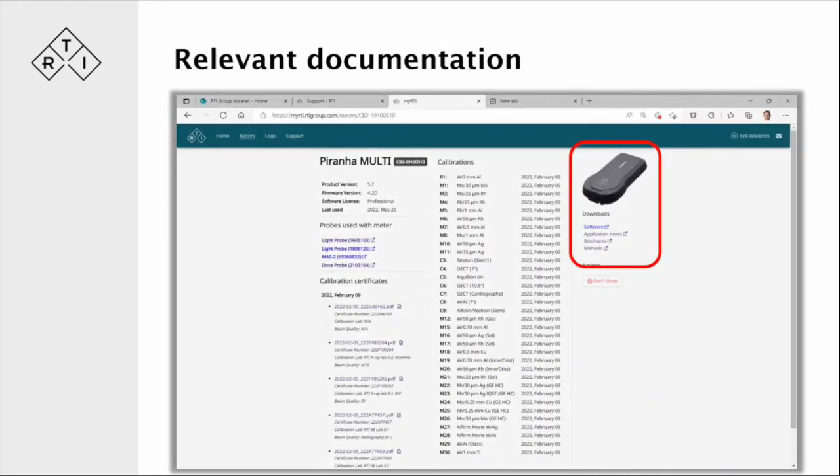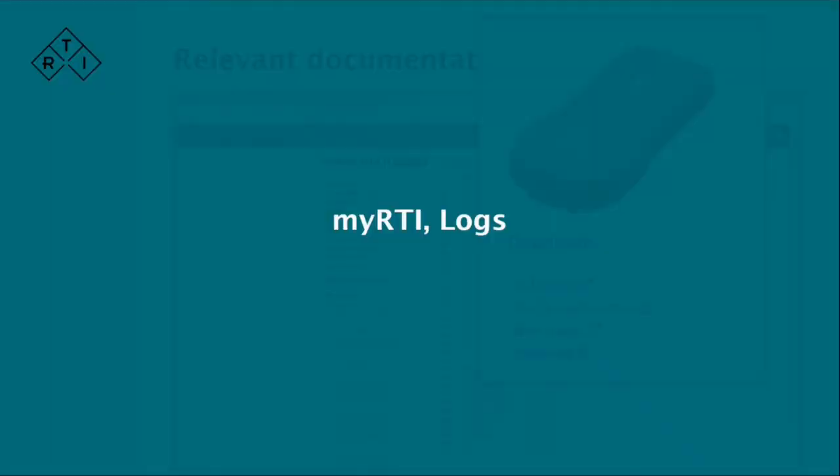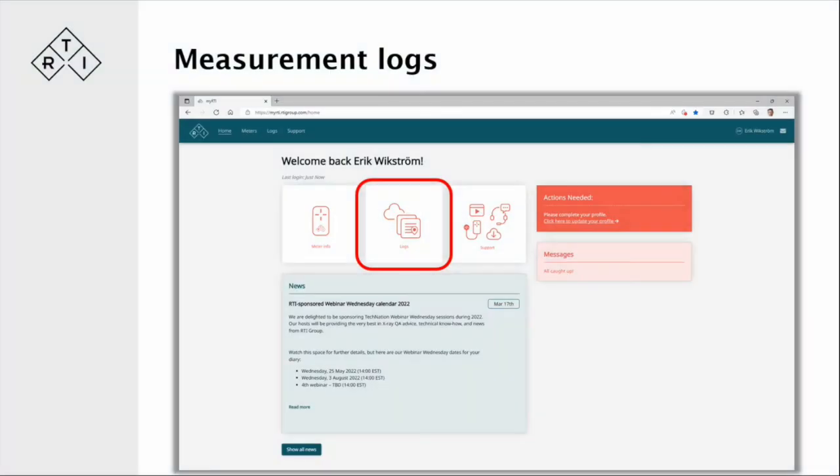There's also the interesting ability to find documentation. If you click up here, I will take a closer look. You'll be able to download relevant software. You have relevant application notes, brochures, and manuals for the Piranha. So you'll have access to that, which is quite useful.